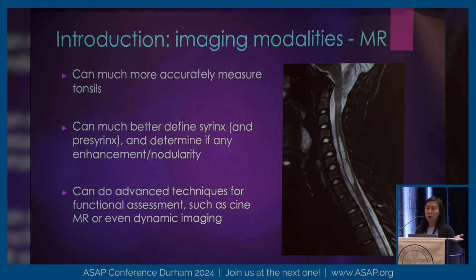So what about MR and Chiari and Syrinx specifically? So as you can see in this image, this is an MR of the cervical spine. I've put up the STIR image in this particular case just to show you. So the CSF is bright, so it's a fluid-sensitive sequence. STIR is a fancy name for short tau inversion recovery, or it's actually the acronym for the fancy name.